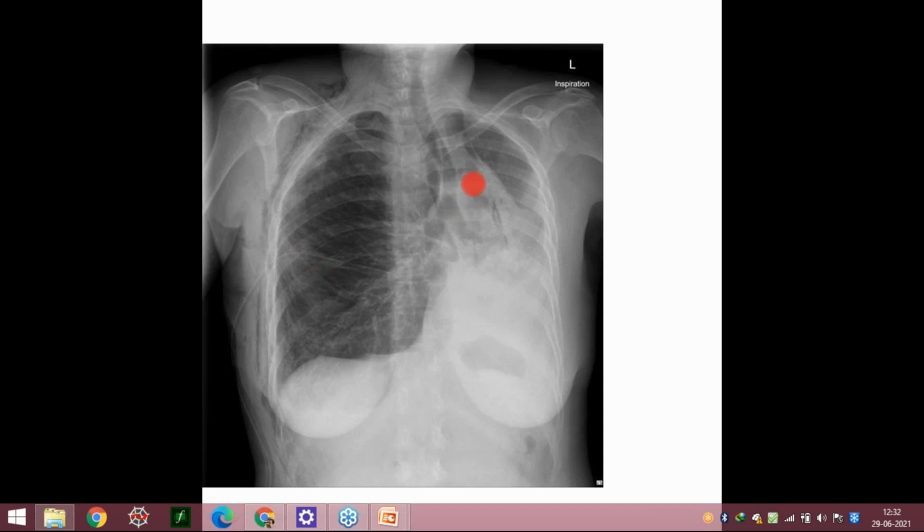What a tumor does is that it presses on the airway, or sometimes there could be a tumor here which is pushing the trachea towards the left side, but it will not cause this. So here the commonest, probably the only differential would be a fibrosis because of the causes that Nilayan has mentioned. And there are some other causes as well.